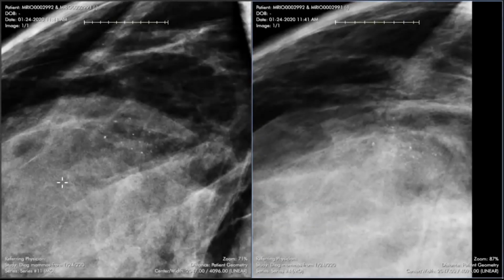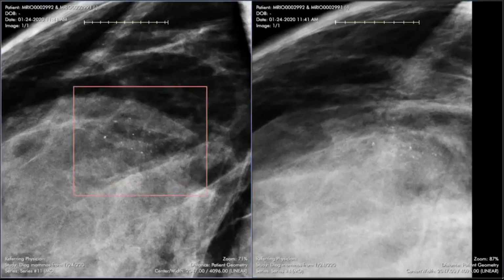Here's another patient that was recalled from a baseline screening mammogram for calcifications. And my left image is the callback mammogram magnification CC view. And I know the images are definitely harder to see on probably your home computer than if you were using a breast imaging monitor, but hopefully you can see this group of round and punctate calcifications in the outer breast here. And this was on a baseline exam.